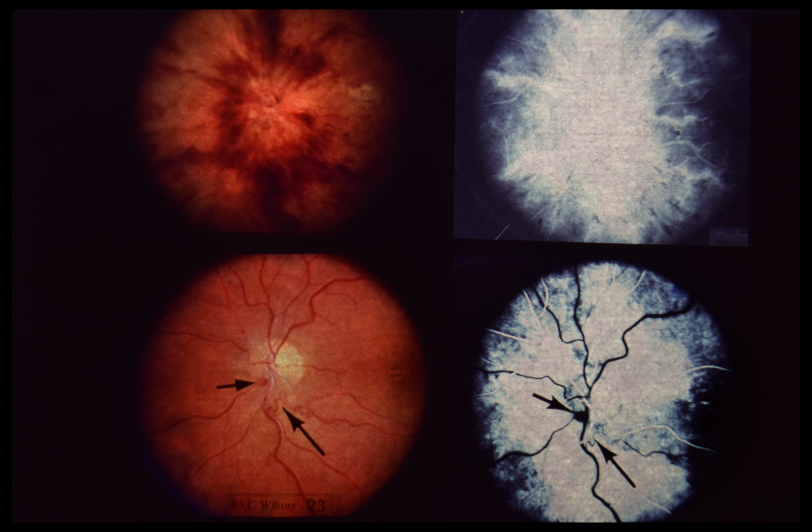Upper right. A fluorescein angiogram shows diffuse dye leakage from optic disc vessels and retinal veins. A medical evaluation that included a complete blood count, erythrocyte sedimentation rate, serum protein electrophoresis, and a 5-hour glucose tolerance test was normal, and no treatment was recommended. The patient noted no further change in his vision.